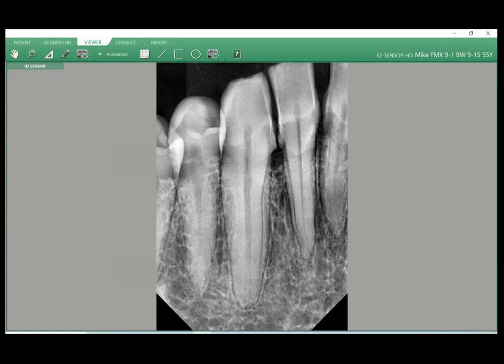Only thing, Paula, I think we should show is go ahead and go up to the patient's information up there on your annotation and add that. Yeah, so off to the right, add the patient's information, the icon second to the last to the right. Oh, this one. Yeah.